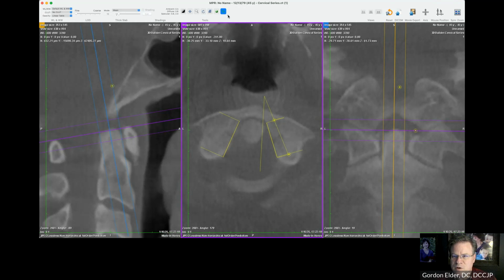For this side, since you saw the official way to do it, I am going to be super careful over here, and just in the interest of time, going to eyeball the center there. Now we're going to come back, get our angle.